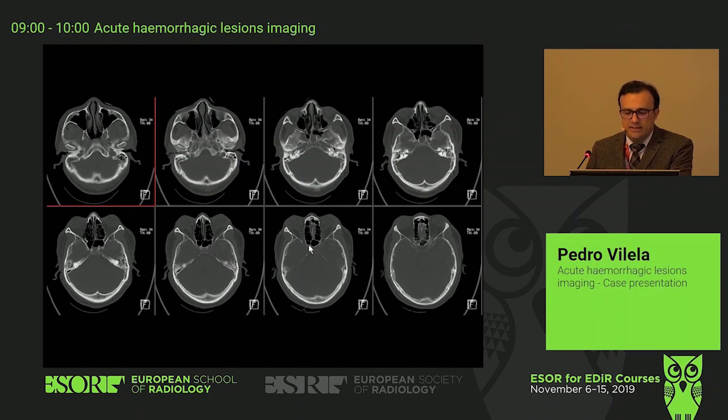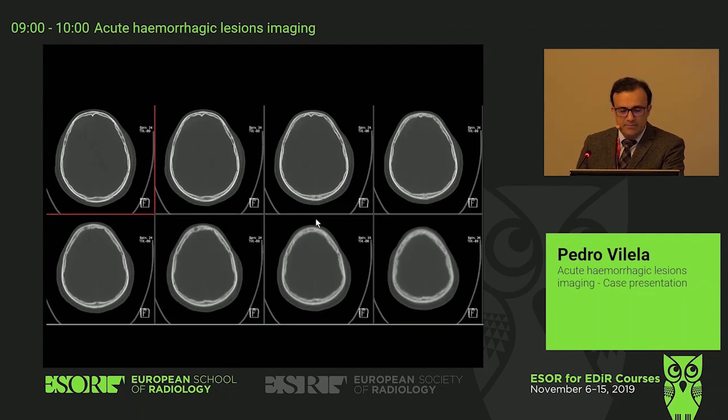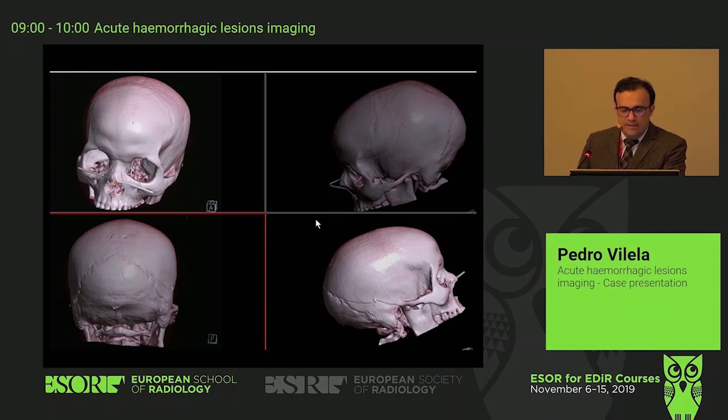And the carotid at the cavernous sinus. Okay? But we have filling of another cavity, not only the sinus. What is happening here? It could be, again, inflammatory, but in a trauma patient, we are looking and we have the middle ear that is filled. So we need to look carefully at this. And we are going to pass this.